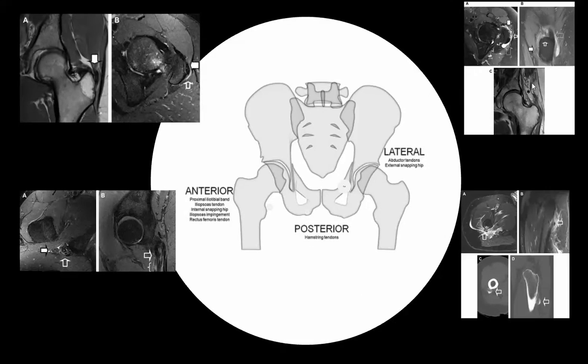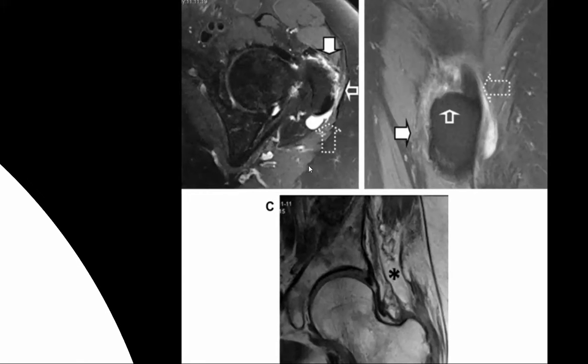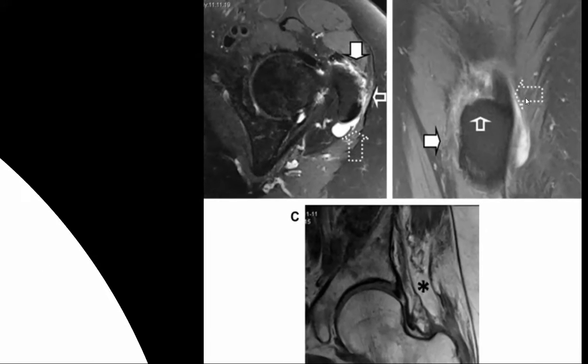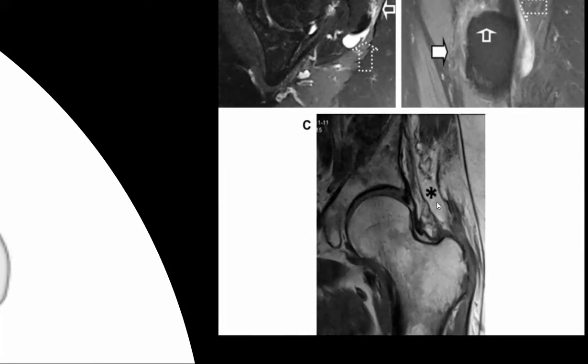Let's have a look at some more examples of tendon abnormality. Now this is a full thickness tear. This is again the gluteus medius tendon on the greater trochanter, which is bare. It's just got this rim of irregular fluid, so the tendons basically come off. We can see the fluid here again, and we can see the bareness of the gluteus medius tendon insertion.